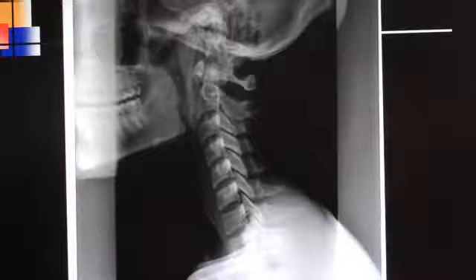And lateral masses are really weird just because they have not well-defined edges. And if you look at an atlas again, you'll see that all the edges are kind of scooped out and kind of fade to nothing. And that's because it's not a square box like a lot of people want it to be.